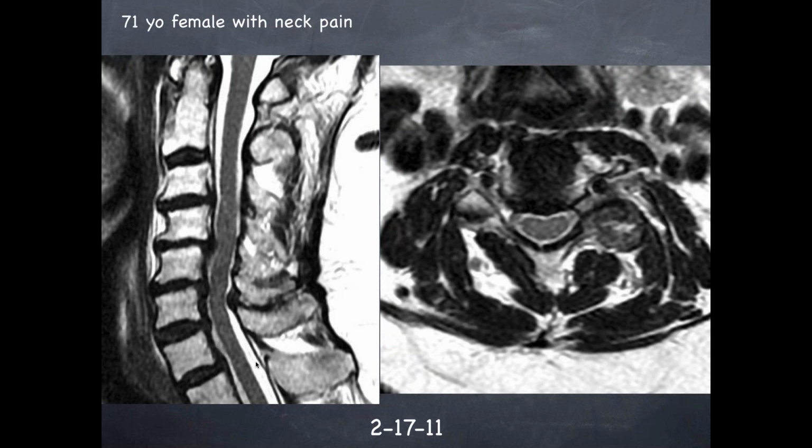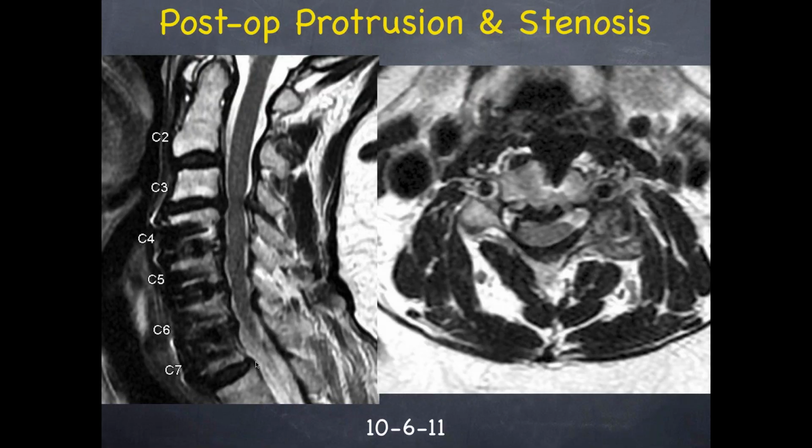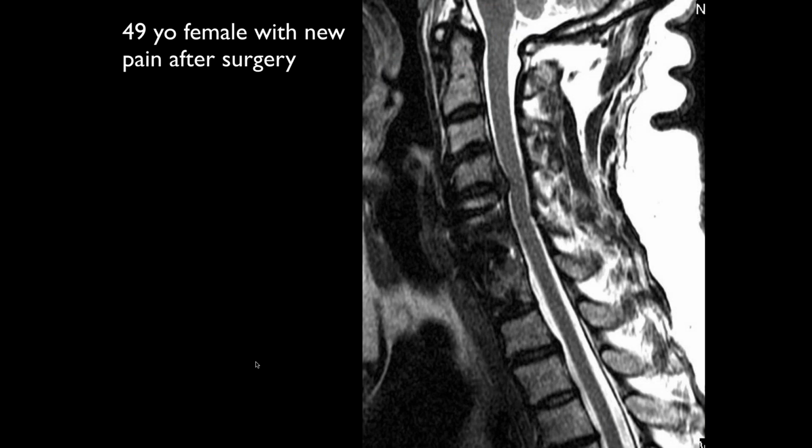Yeah, well, I don't know exactly clinically what's going on. I think it was just neck pain. I don't think there was any radiculopathy. But I would imagine in 71-year-olds, this is probably a better looking cervical spine than about 50% of 71-year-olds. I certainly agree with you. A cervical collar at night for a couple of nights probably would help to cure it. Okay. Shiv, what do you think of this one?